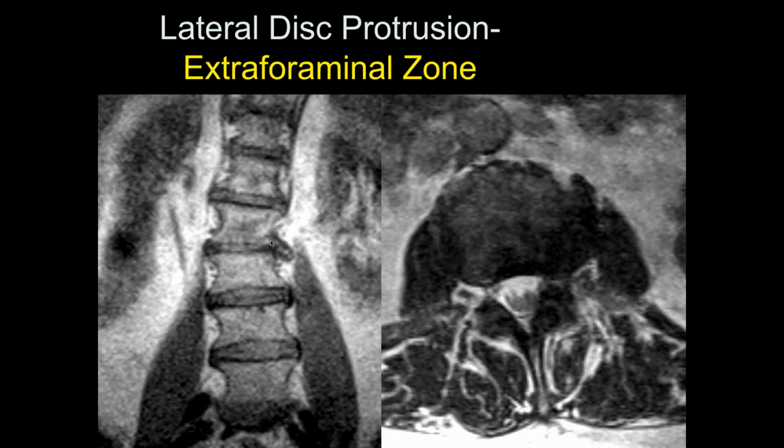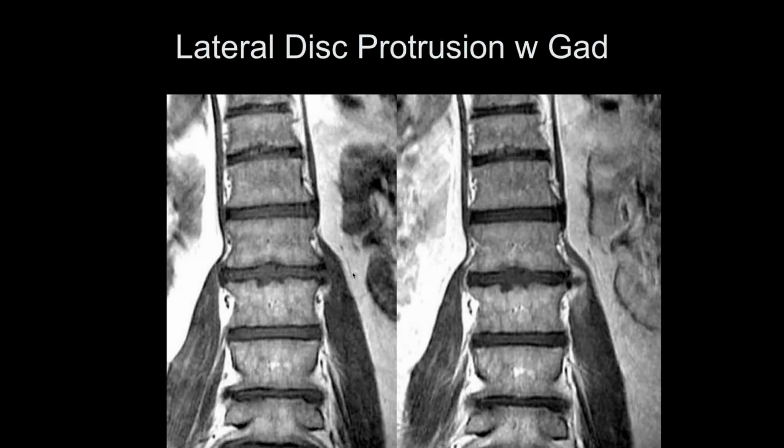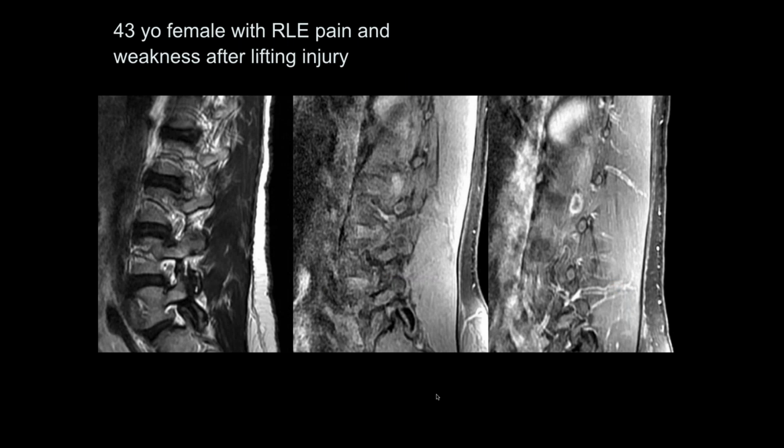And then you can get extraforaminal zone extrusions as well. Here we can see, or the far lateral zone, as some people say. And there's a case where we can see the typical enhancement pattern that you see on a far lateral disc extrusion in this particular case.